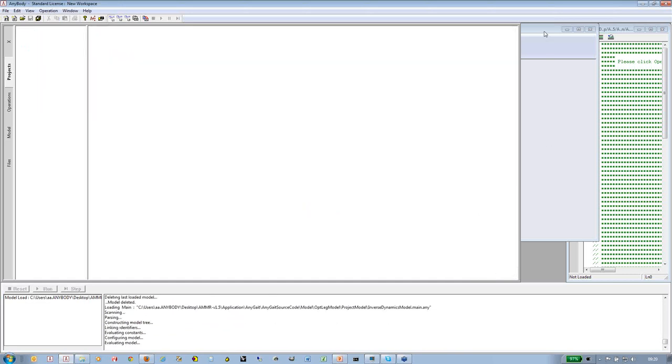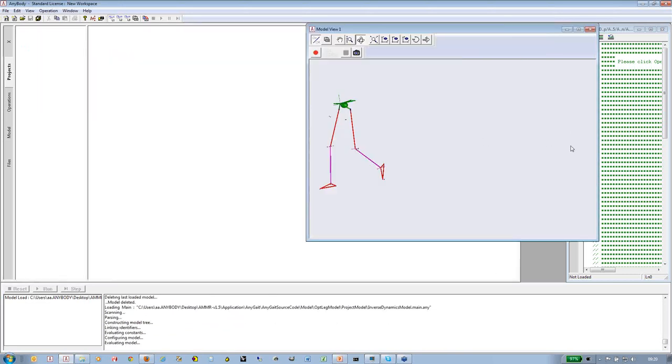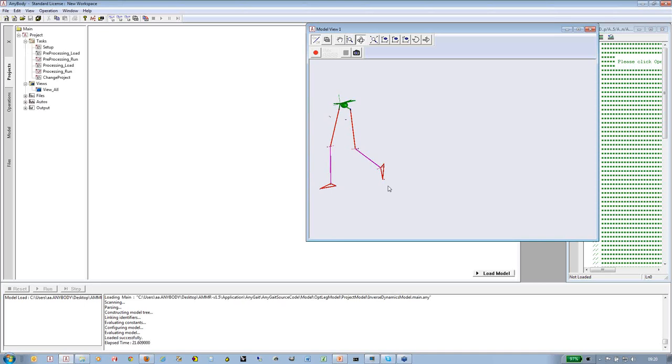So what happens in here is we are scaling the body model, the AnyBody body model, according to the dimensions of the stick figure, and the stick figure is using the markers. So it has the dimensions of the subject from the MoCap trial.